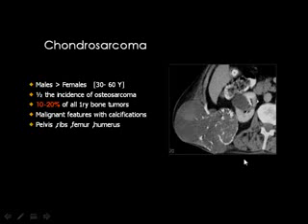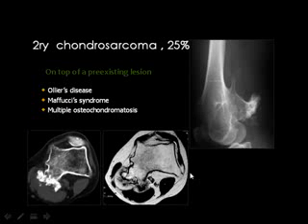The chondrosarcoma is easy if it shows the classic configuration, which is a malignant mass showing the malignant criteria: cortical destruction, an extraosseous soft tissue component, and the soft tissue component contains calcium. And calcium is the diagnostic hallmark of the chondrosarcoma. Calcium, of course, is diagnosed better by CT rather than plain X-ray and MRI.